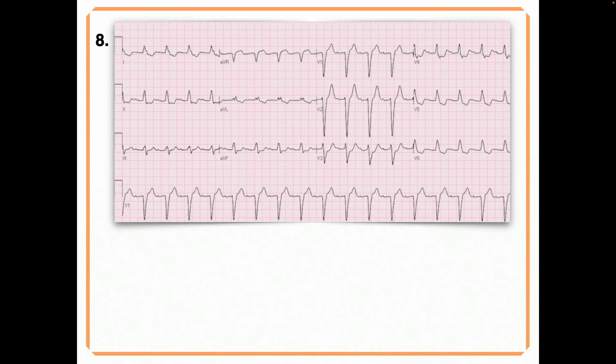Okay, number 8. Have we done this one before? Doesn't matter, I guess. Riley, number 8, please. All right, there's a left bundle branch block.